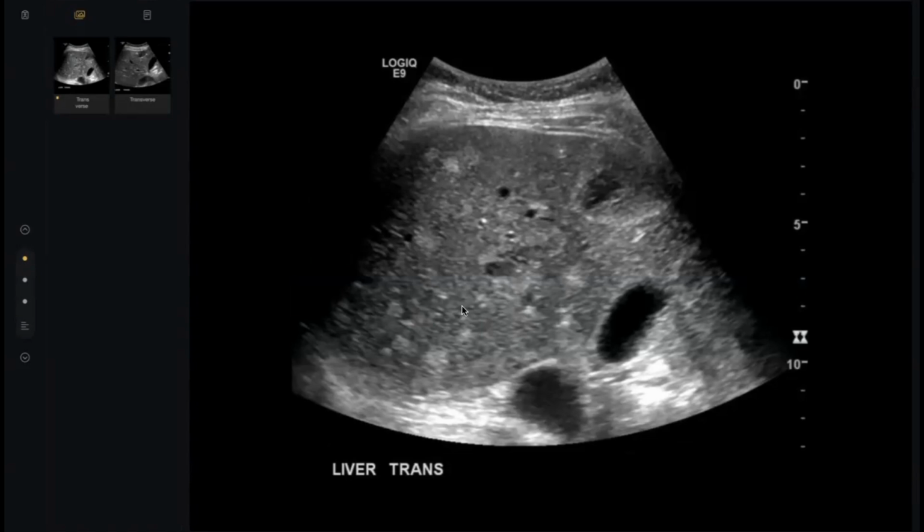What else? But the patient is asymptomatic. And look here, no mass effect. This is a vein, and the biliary tract is completely not infiltrated or compressed by the mass. Here also. So it is benign looking. What is your differential? Multiple echogenic lesions, so these could be multiple hemangiomas. What else? But see here, multiple variable shapes, bizarre shapes. See, no definite shape for them. You can't tell me these are rounded or oval, they are bizarre in shape.